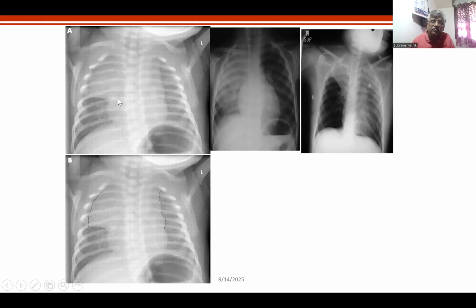This entire thing is thymus. Uniform density. Whereas there is heterogeneous opacification in a consolidation. In a collapse also there is heterogeneous opacification, but there is more density because it is collapse. All these structures are in one pack, which means it has to be more radiodense. But this density is not as uniformly more dense. Okay, if you want to say collapse. You understand? Thymus is physiologically isodense and spreads. This is how you get thymus.